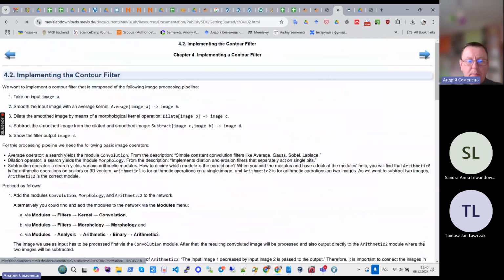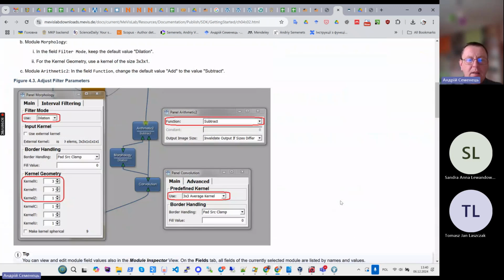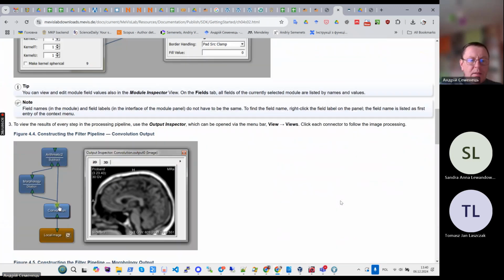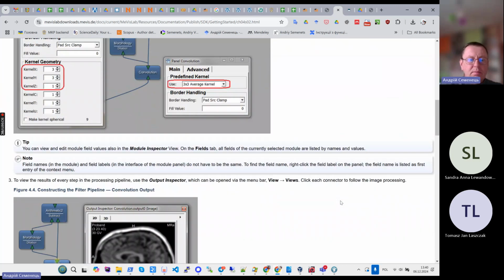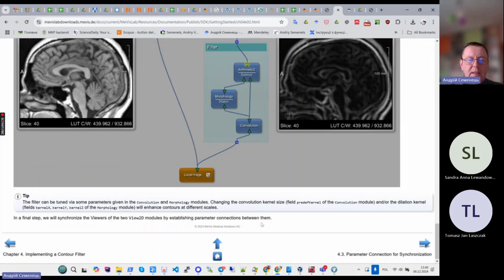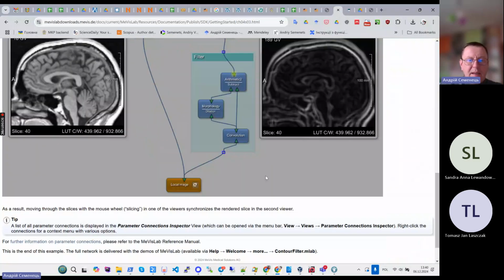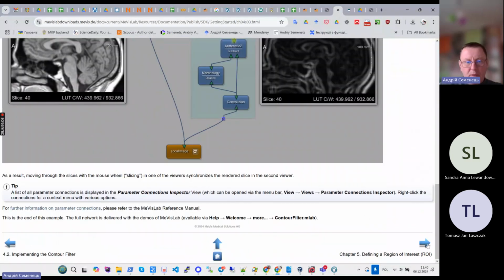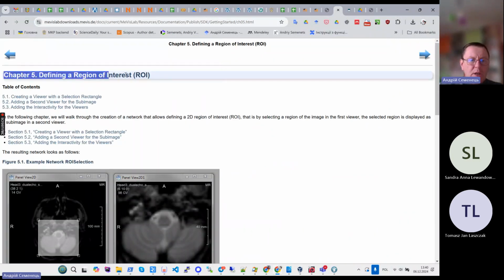Thus, you have a step-by-step instruction on how to achieve all this. Sure, you need to ensure that you use proper settings. You also have to create a sync between images. It is explained how, and I will omit this for now. And an even more complex mesh you have to create in your chapter 5.